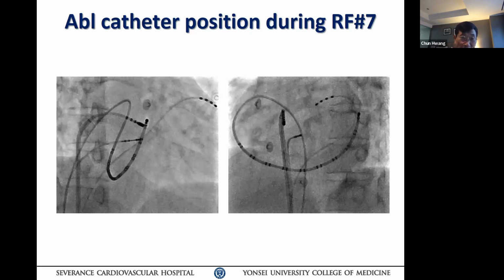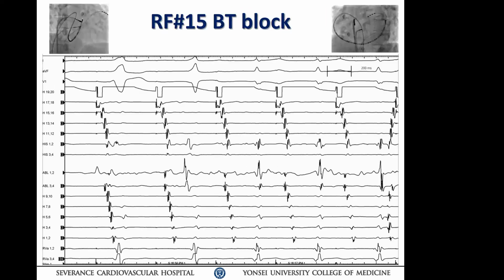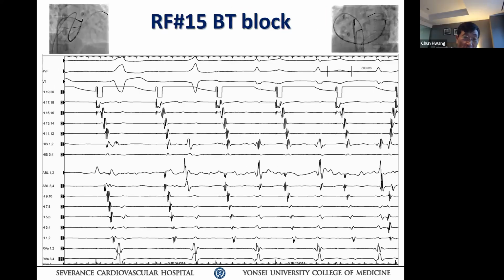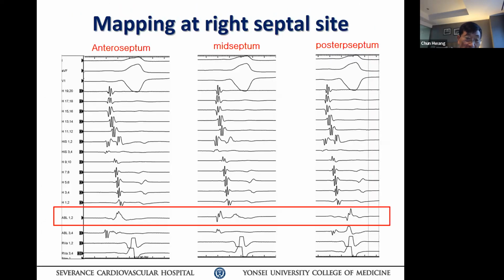Okay, let's go. So you ablate that successfully? Yes. Okay. Now, if you go back to your ablation signal that you showed me, anteroseptum. Which signal is better? Your ablation distal or proximal? Where would you ablate? Why is that signal no good?